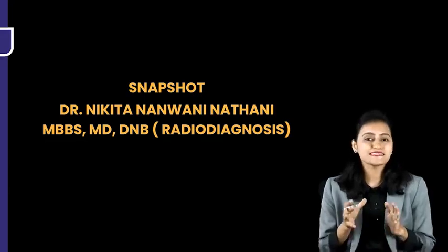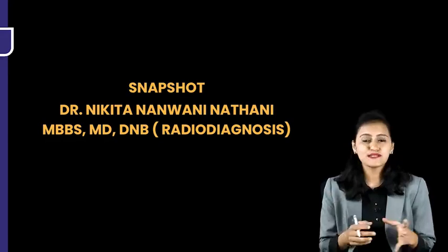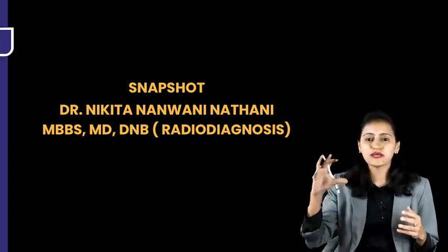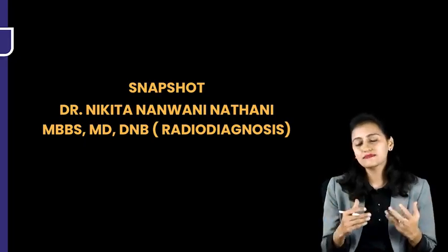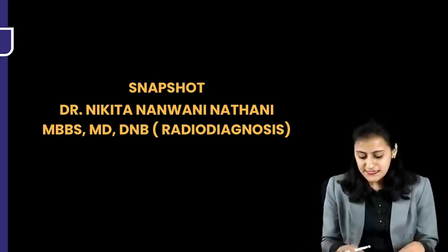And here we are to discuss snapshot, that is all the high yield images in radiology. So this is going to be like a last minute revision of all the important images in radiology. So we would be going stepwise, that is first a quick look at images in the general, the basics of radiology. Then we'll be seeing the investigations, identification, then the normal anatomy. And then we would go system wise to look at the various pathologies. So starting with the general, that's the basics of radiology.